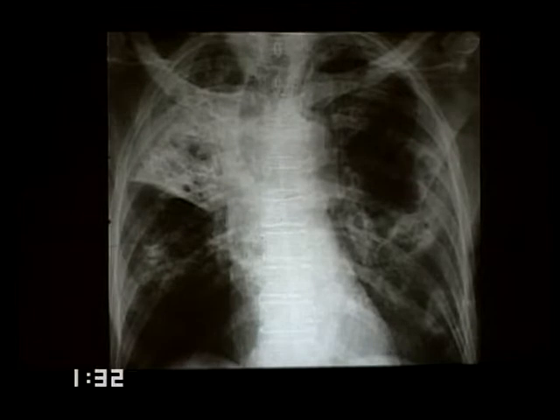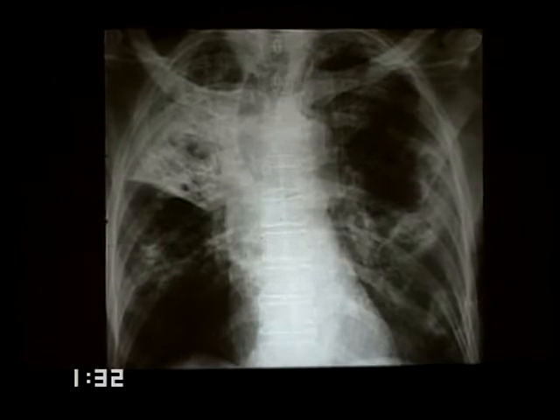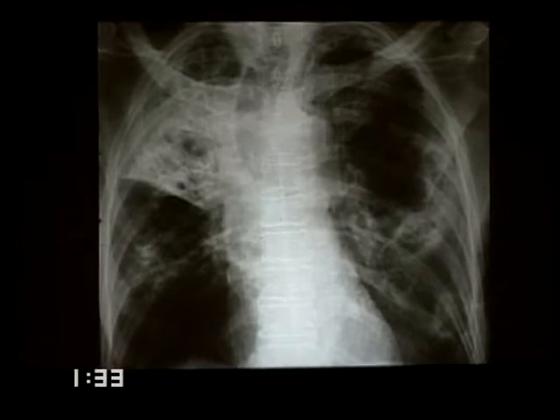It is actually one of the gram-negative infections. Gram-negative infections and anaerobes must always be considered in this situation. Tuberculosis typically looks exactly as the textbook says it should.